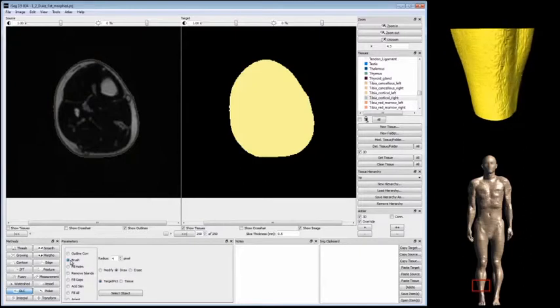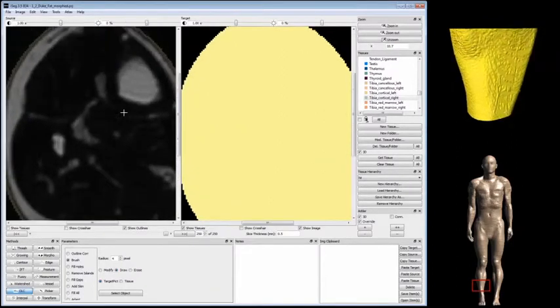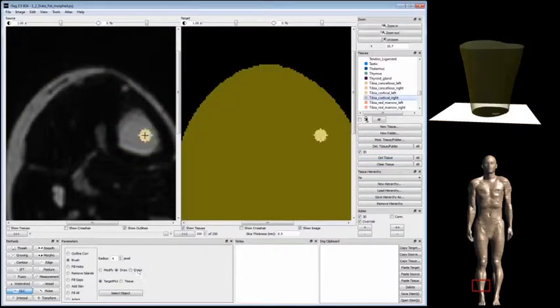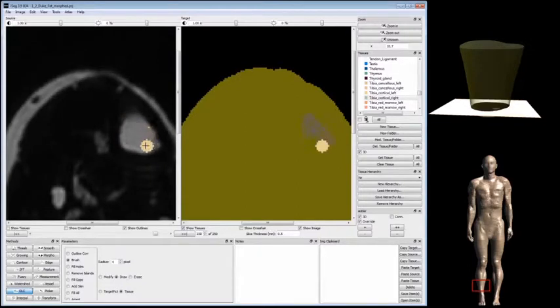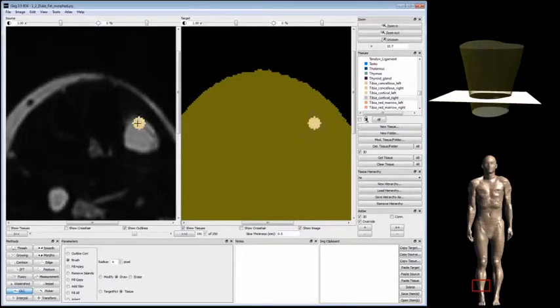In a first step, we select the brush tool, which is found in the OLC tab together with various other outline correction tools. We then outline the tibia on every 10th slice with the brush size set to 4 pixels. It is sufficient to paint the tibia on every 10th slice, as the tibia is a rather large bone with a quite consistent course. You can see that in iSeg, the window to the left shows the MR image, which serves as basis for the segmentation, whereas the right window displays the segmented tissues.